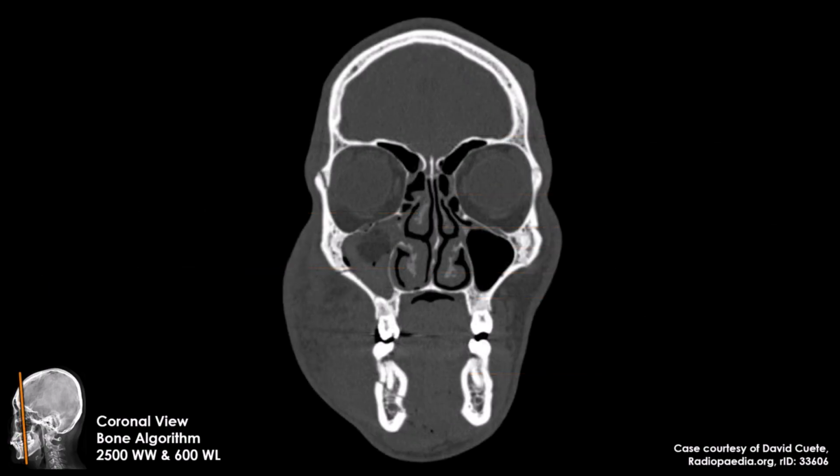Moving deeper into the face, this is a very good image to describe the bones forming the orbital cavity. The superior orbital margin is formed by the frontal bone. The lateral orbital margin is mostly formed by the zygoma or the zygomatic bone.